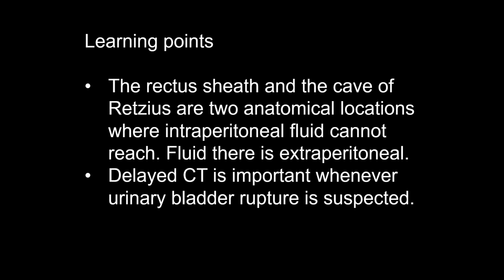In the present case, the tear was large and could be seen on the early post-contrast CT, and it has been supplemented by an abdominal radiograph that proved the extravasation of urine. But in case of a small urinary tract tear, the delayed contrast-enhanced CT is an essential part of the examination.